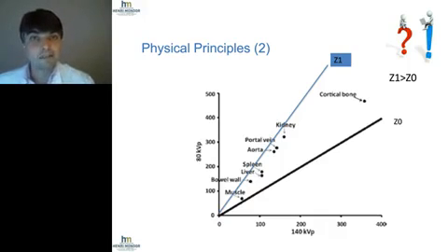What you can see is that material Z1 does not behave the same way as material Z0 when it's exposed to either 80 kVp or 140 kVp. There's a difference in attenuation levels. So the attenuation profile of those two materials is actually different when they are imaged at two different energy levels.